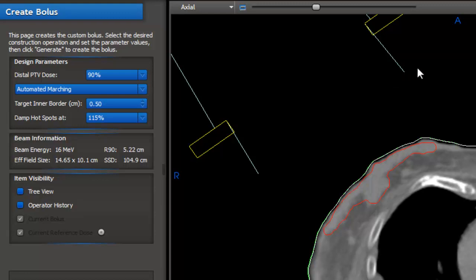A discussion of that normalization can be found in a little more detail in our help guides for those of you who are interested. So we're going to have our distal PTV surface match the 90% line. Most of our operators rely on having a consistent normalization, so we try not to use a normalization in P.D. that moves, say, the field max or a particular dose at a point in P.D. We avoid that because most of our design operators rely on having a standard location of normalization. They work much more effectively with a normalization that is consistent throughout the design process.